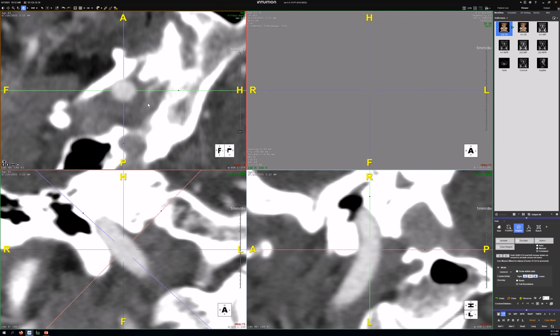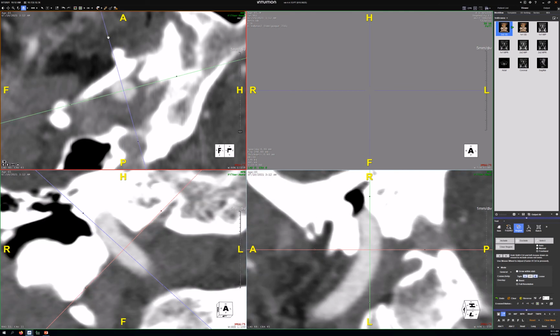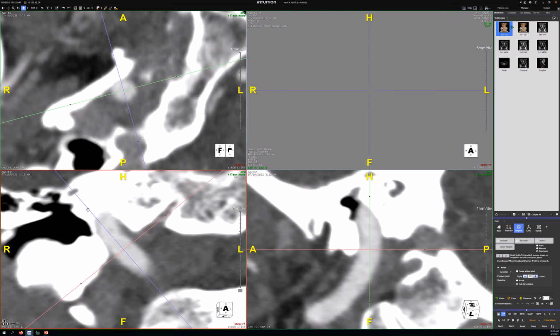Now rotate it so that you're capturing the long axis of this cross section. Rotate it. Stop there. And then fix it down here and down here, so you're absolutely perpendicular to the tangent of the center line. More or less, that's correct.